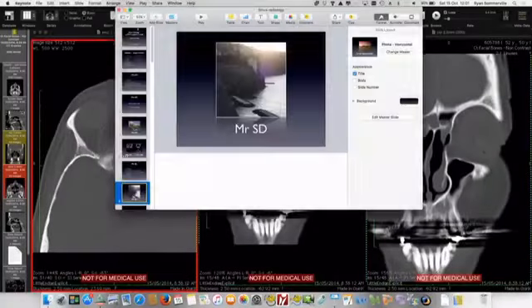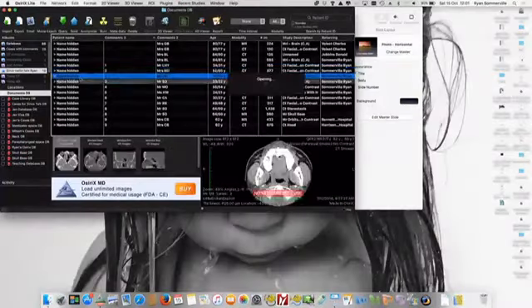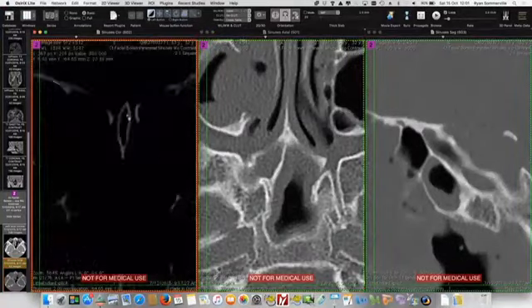So in this particular patient, so I'll just scroll these. Oh.